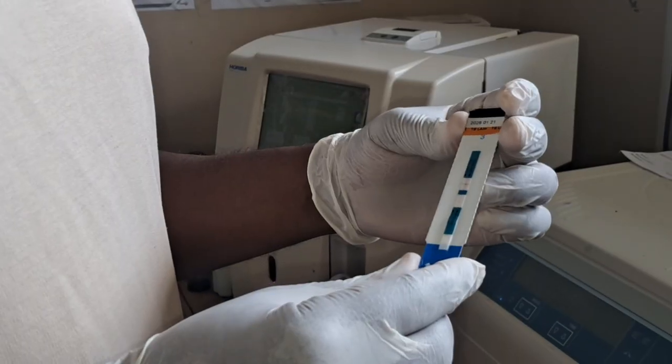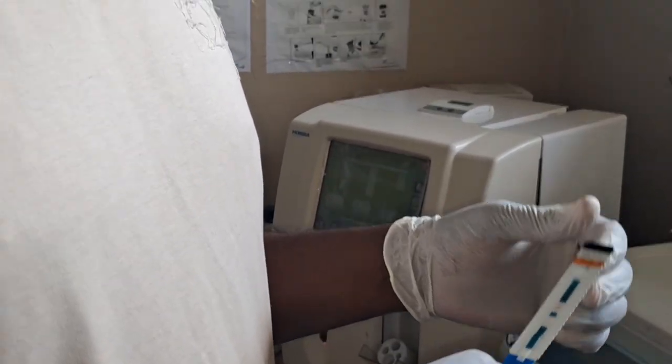So that is all for our video. For any questions, as we said earlier, you can communicate through the portal. There are lab personnel who will be more than willing to help. For clients and patients that you suspect of TB, after doing urine LAM, you can also send samples for sputum. For adults, you can kindly send sputum. For children, you can collect stool. You can also send stool for GeneXpert.